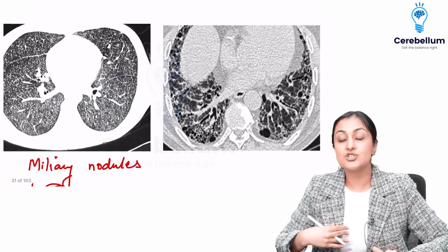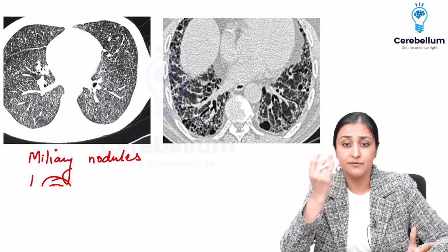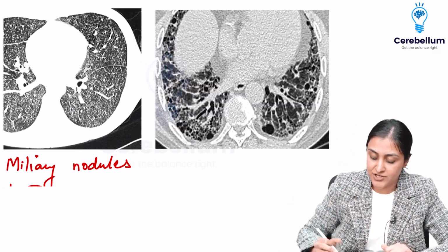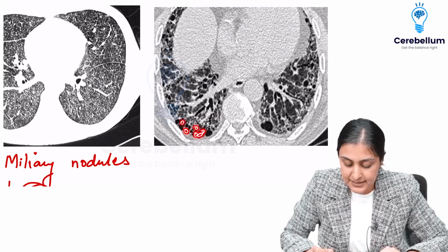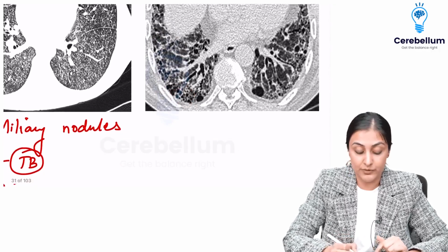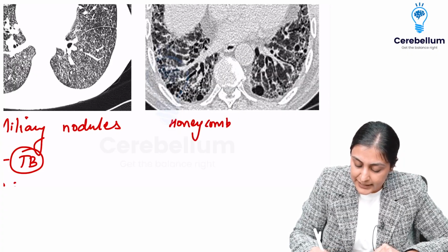This is an interstitial lung disease. They'll give you spirometry findings. They'll give you rales. Okay, so spirometry showing restrictive lung disease. And then what you are seeing here on the HRCT, can you appreciate these black things? This is what looks like a honeycomb. There are various cysts which are stacked one on top of the other. So this finding is what is called honeycombing.